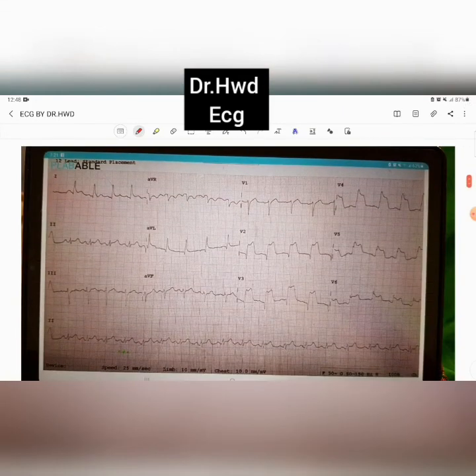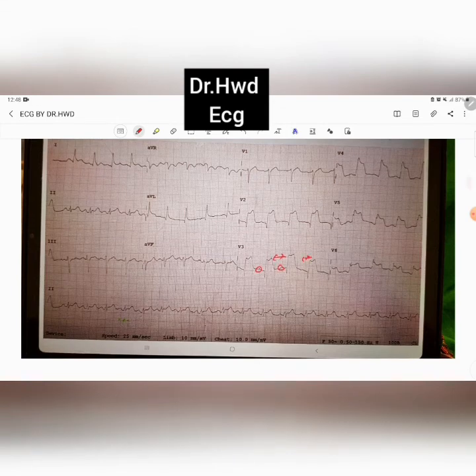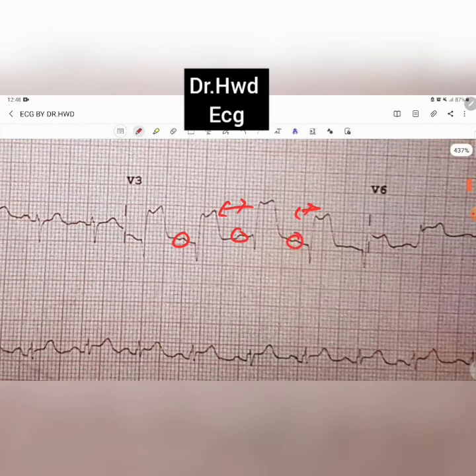All right, okay. Now what is this one? Look at the QRS, right? First look at the RR, determine the rate, look at the P, right? I'm going to zoom in a little, look at the P, seems fine. Nothing to do with the PR interval. PR interval seems fine. So what do we do next? We move to the QRS complex. Right, in the QRS complex, you have to see whether there's an ST elevation or not. To determine the ST elevation, look at the base and look at the S. I mean, this seems fine. It's not a notch. It's not like this, right? It's not slanted. It's fine. It's a straight line. So S is fine.